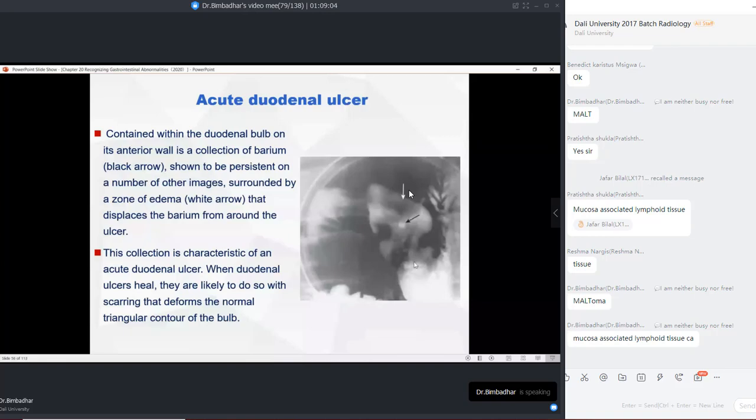You recognize it by the sudden narrowing of the stomach, which is the location of the pyloric sphincter. The opening of the stomach is nothing but your pyloric sphincter. The sudden narrowing of the gastric area is the region of the pyloric sphincter, and the next part starting from there is the duodenum. You are going to see an area of niche as well. You see a white hyperdense oval round collection of barium along the duodenum. This one is a niche.